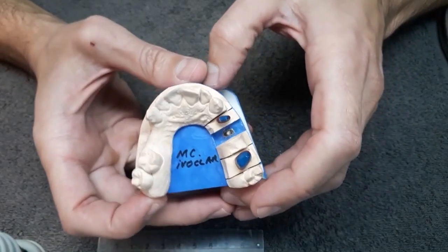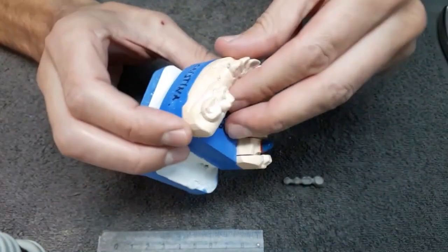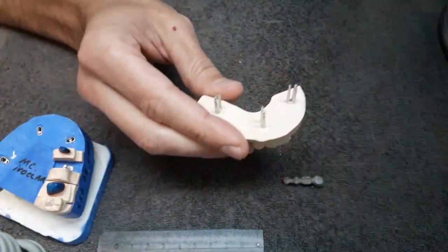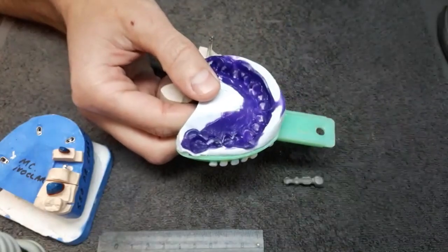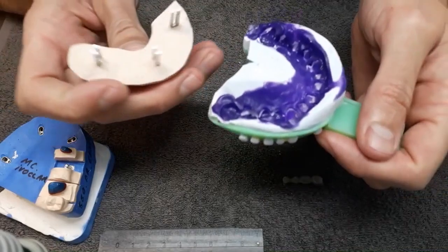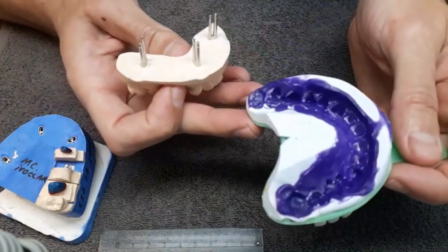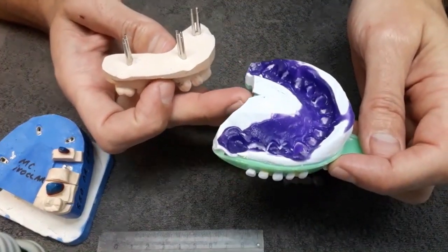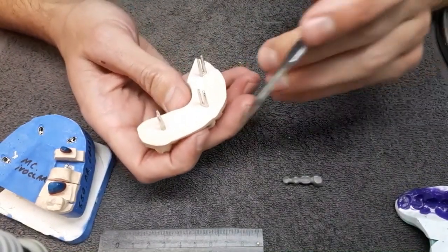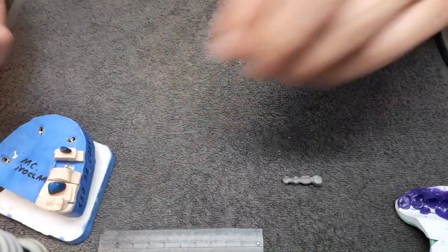There is a kit to obtain this kit of pins, and there is a tool called Pindex. Because you cannot simply press these pins into the impression. You can't have it like this. You have to pour first the plaster, then this plaster will be trimmed, will be drilled exactly in the place where you want to have the pins, and for this you need the laser guidance, and then you glue the pins in. There's going to be another movie that shows exactly how this model is produced.